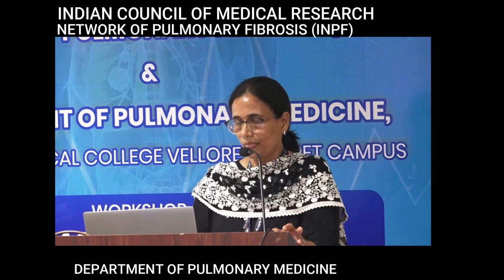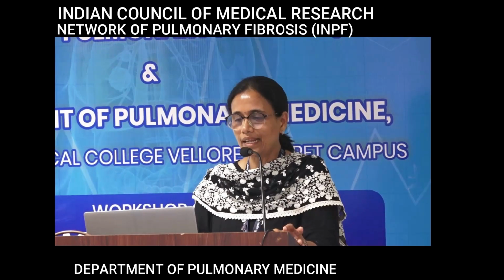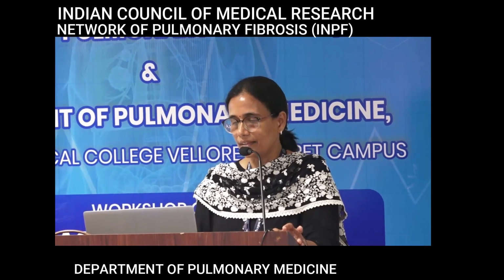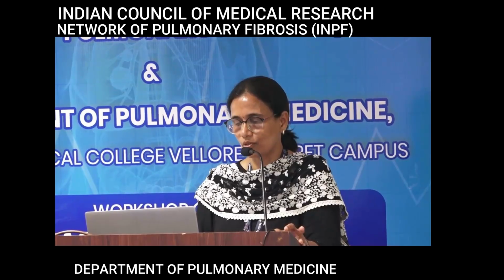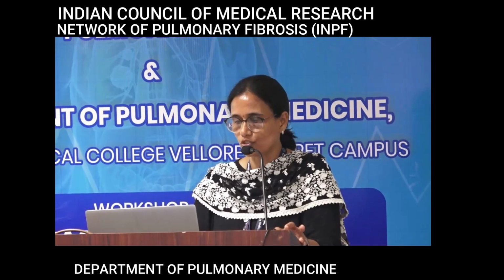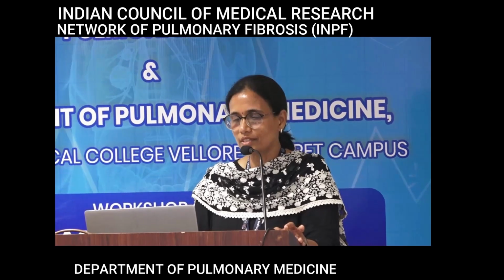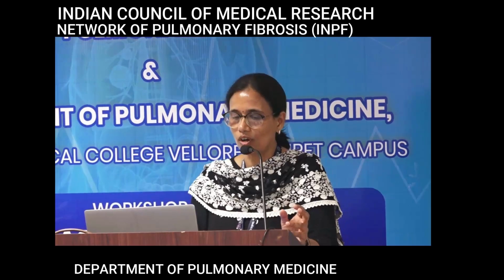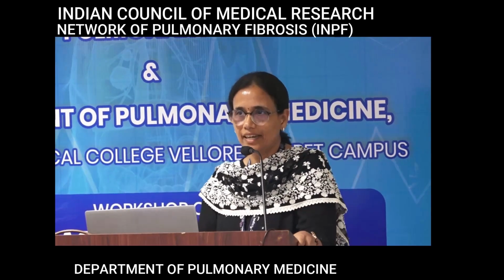What about this patient? What we are seeing here is mainly a mosaic attenuation. So we are having higher density areas, we are having low density areas, and some reticulations, a little bit of fibrosis. So mosaic attenuation, again, an alternate diagnosis we need to think of. And what is this pattern called? What is this sign called? It's called the three density sign.